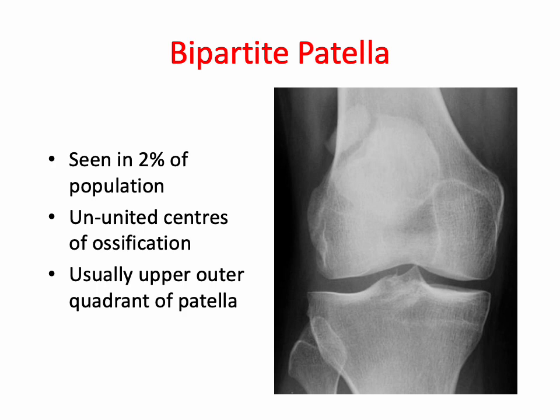Important to not confuse a bipartite patella with a patellar fracture. Bipartite patella is seen in about 2% of the population and is the result of non-united ossification centres. A key with the bipartite patellas is that they'll be seen in the upper outer quadrant of the patella.